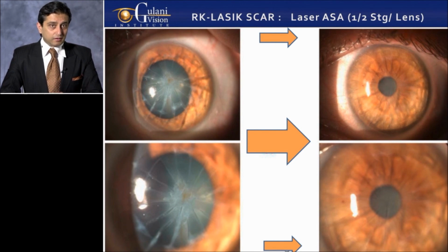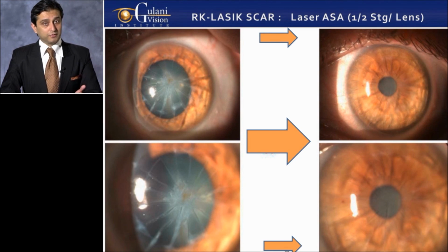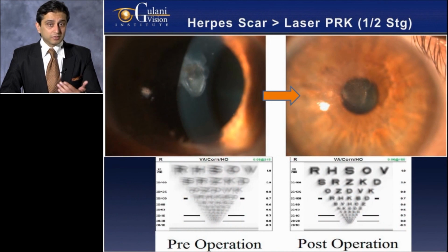Here again you can see an RK case with scars where I planned two stages, but based on the OPD's severe deterioration in vision, you first do laser to clear the scar. Now I'm planning an internal OPD on this patient and planning for a lens surgery to take them as close to emmetropia as I can.